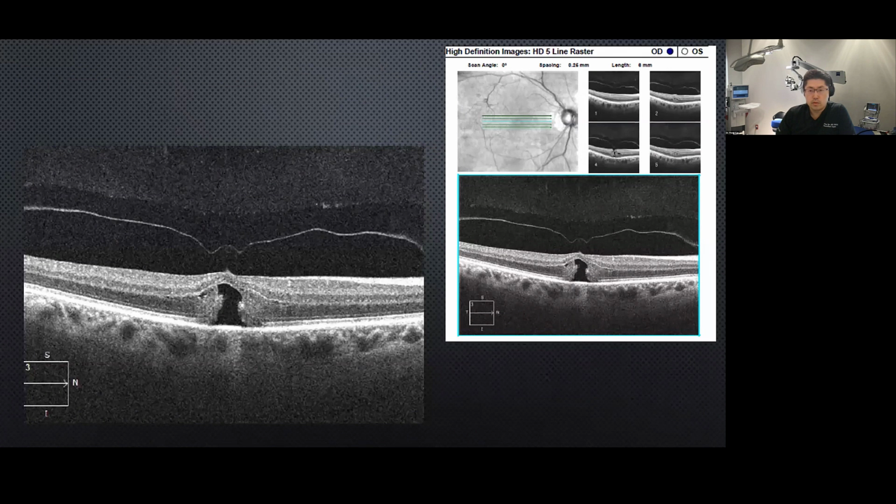A really quick word about obtaining OCT images in your busy practice. The first thing you do is make sure of the quality of the image, the name of the patient, the laterality of the eye, and the date of acquisition before you proceed, so you know you have the right patient, the right eye, and the right date. Often the picture you are presented with might not be the right slide.